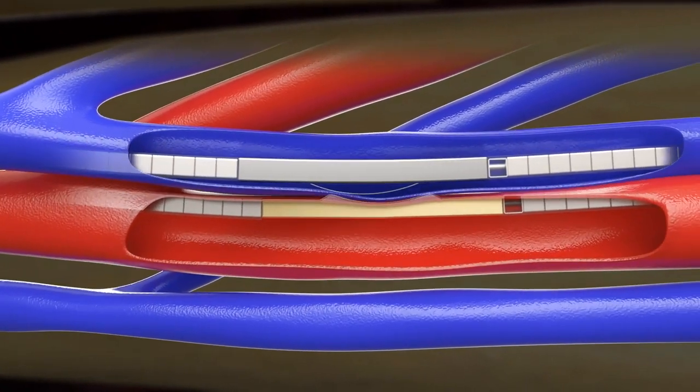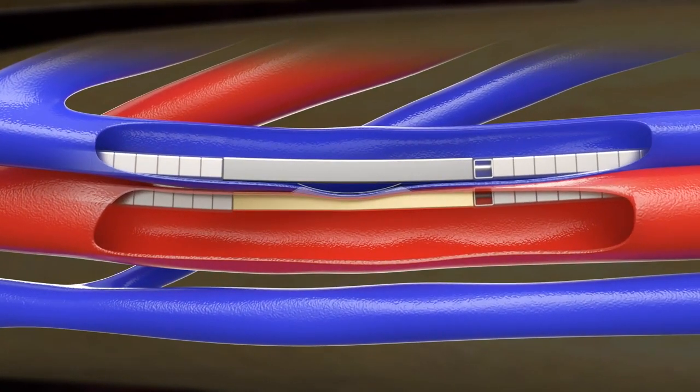Once correctly aligned, advance the venous catheter until the arc of the electrode sits within the concave surface of the backstop on the arterial catheter. The electrode should appear compressed. Both catheters contain a series of magnets that allow them to coapt and maintain proper rotational alignment to one another.